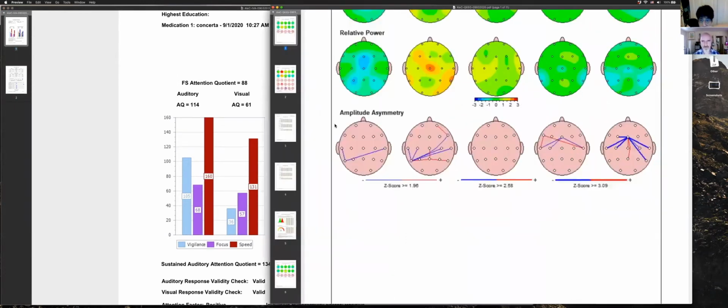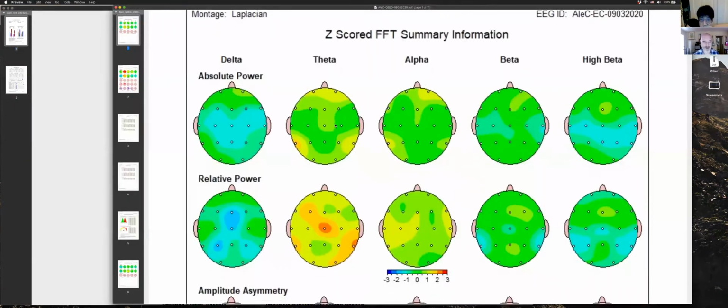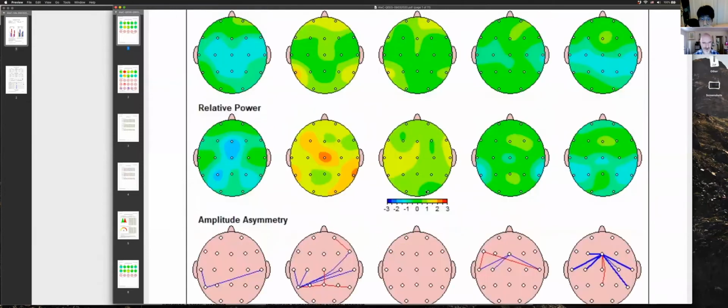All right, this is your brain. This is you compared to the average person your age. There's the bell curve right there. That's the scale. And here's the threshold, essentially. So you want to look for things that are 1.5 above or below average.